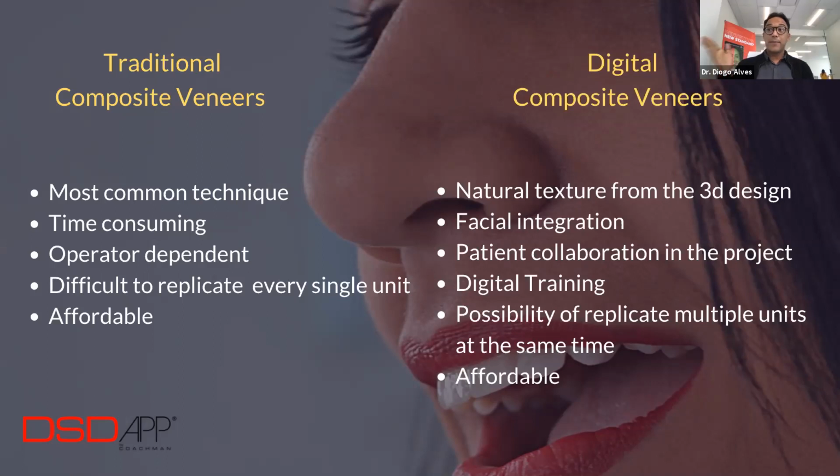Yeah. And you guys will also see that once you create a 3D design, the app will already generate an STL file that will allow you to create multiple units at the same time. So it cuts the time in half. All that you have to do is to understand the procedure and understand the technique.